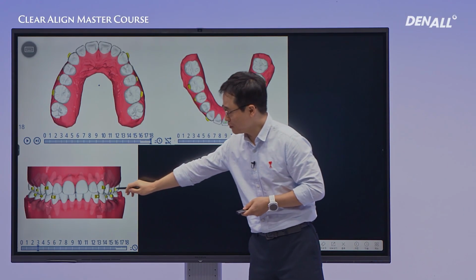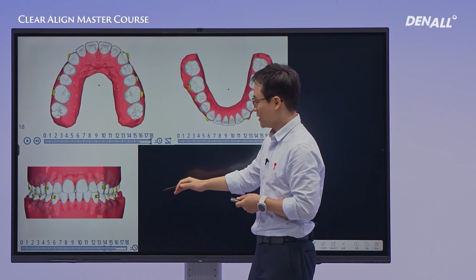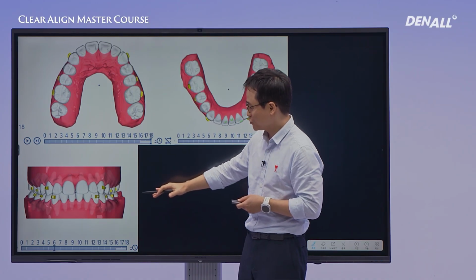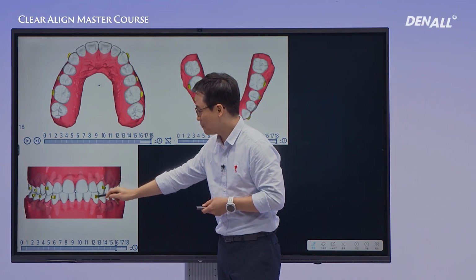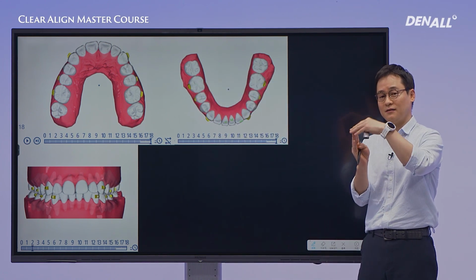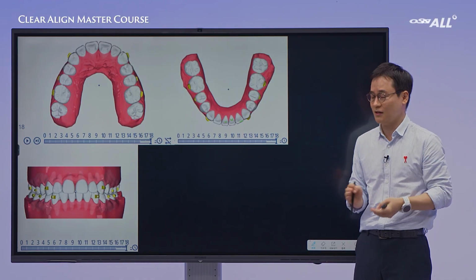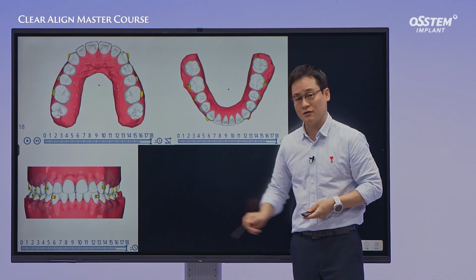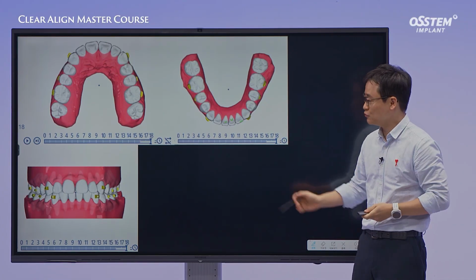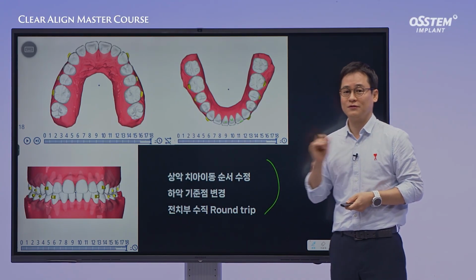We went through a few corrections when taking a look at the vertical changes. The bite gradually deepens again. Here, the bite gradually increases and then drops toward the end. In such cases, it's important to maintain the raised bite to prevent bite collapse. There's no need to incorporate such downward movement in the simulation. Accordingly, these issues were included in the modifications and a revised setup was obtained.